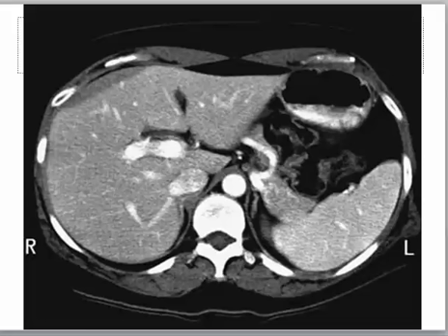Now, what is this? This is something which could be a differential. Here we have the spleen between 3 ribs, and here we have something there. This appearance could be a subcapsular hematoma, could be a subcapsular radiation infarction, and could be capsular deposits. So it is not only hematoma that can cause this appearance, but also radiation and metastatic deposits can produce such an appearance.